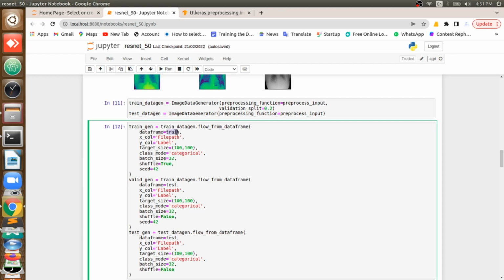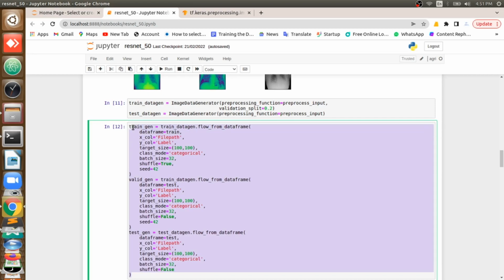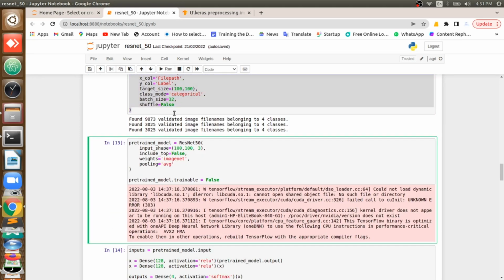To train, which I defined above, I am applying train data gen. Okay, to the test data set, I am again applying test data gen here. It means now I am taking all the images and converting them into arrays after augmenting them. Now they will be in array format. Till now, whatever we did was pre-processing of the data. Now we need to go for model building.